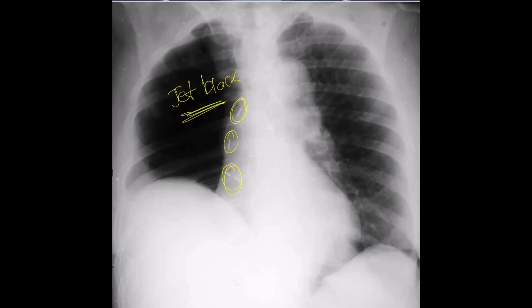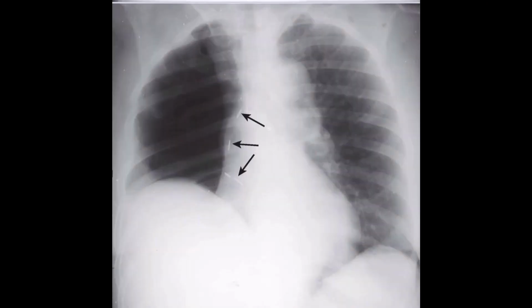Sometimes you can see the surgical removal of the rib as well, especially the fifth rib, but it might not be apparent here. Or you can see it here, it's a clearer version of the image. So that gives you another impression that this is a pneumonectomy.